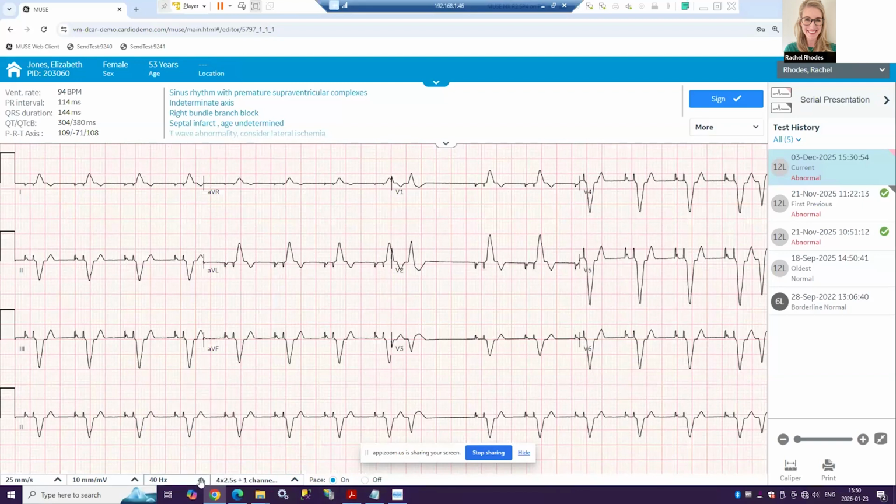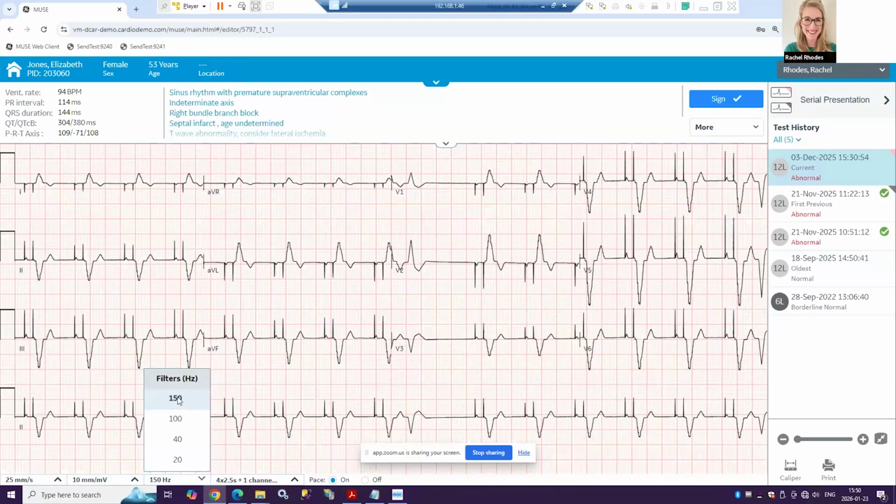You can see as I'm applying it here how the waveform changes. I've never set it to 100 because I always try to leave it at 150. I think if you did that, it would be a global change for everybody using the system. So if it's for a whole site, yes, probably. But if it's just for personal preference, I would probably recommend changing it from below here.